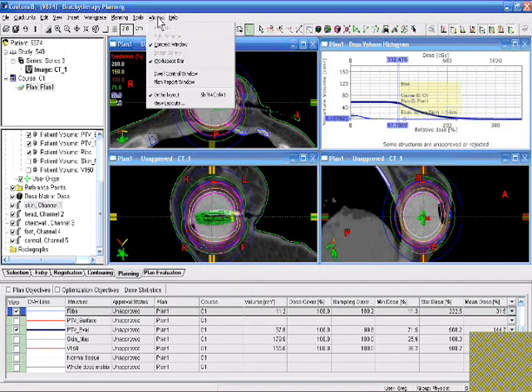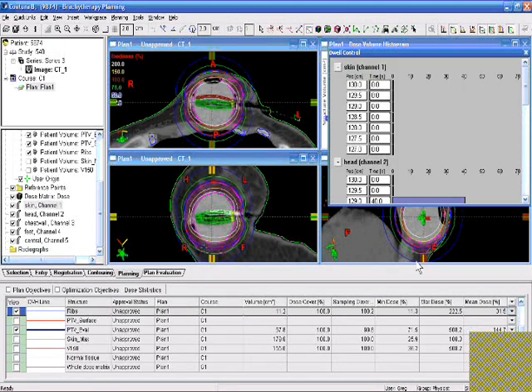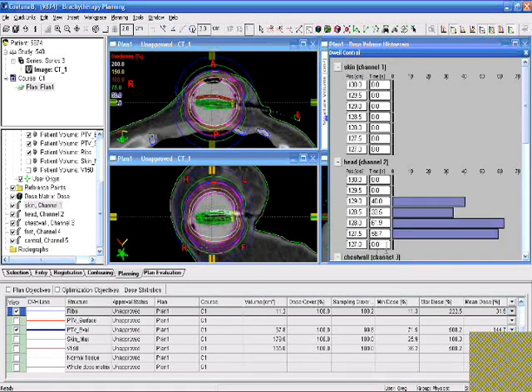For that, we can look at the dwell control window. Pop that down here, and I can stretch it a bit so that we can get as many as possible. Now here you can see that I've given these actual names, and I recommend that if you have oriented these in particular directions, you can give them meaningful names so that when you do the printout, it's more obvious what you've done here.